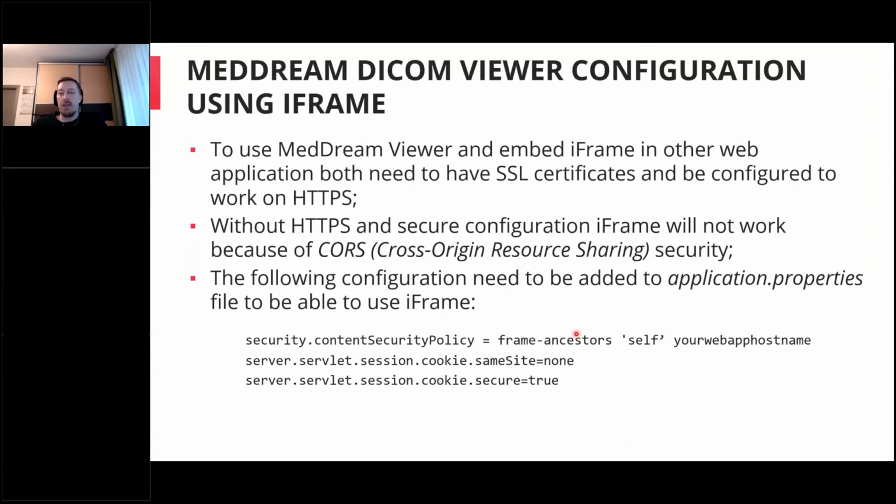So SSL certificates will be necessary, and once you have them in place, if you want the iFrame integration, you would also need some additional settings in the MedDream application settings, where you provide the host name or the IP address of the web application from which you are planning to embed the iFrame.